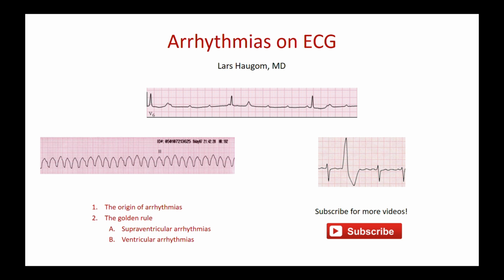And on this first slide, we see three examples here of arrhythmia. Do you recognize them? Of course, you can pause the video and take your time, have a look at them. I'm going to be revealing it. You see AV block grade 3 on top here, a ventricular tachycardia on the left, and on the right we see a ventricular extra-systole, a VES. And these are some of the arrhythmias we're going to be covering.